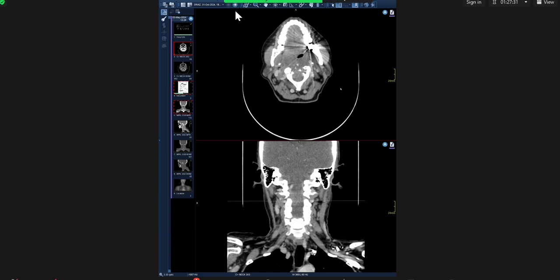Of neck, at the level of the mandible. I can see that in the axial section there is paravertebral increased soft tissue opacity with a narrowing of, causing severe narrowing of the airway, and there is ipsilateral destruction. There is adjacent vertebral body destruction, and it is of low density.